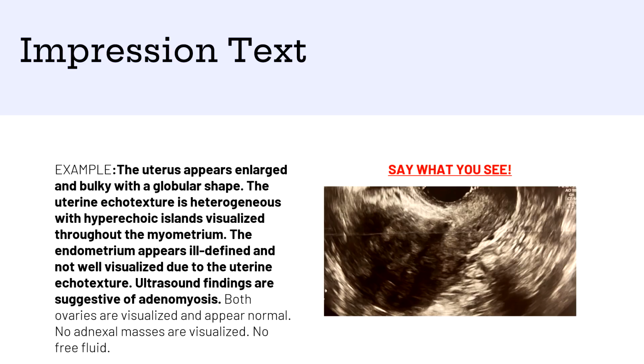And lastly, we've made it to the impression text. Once again, you're always going to say what you see. If you don't see it, don't say it. So for example, this is how we will write a report.